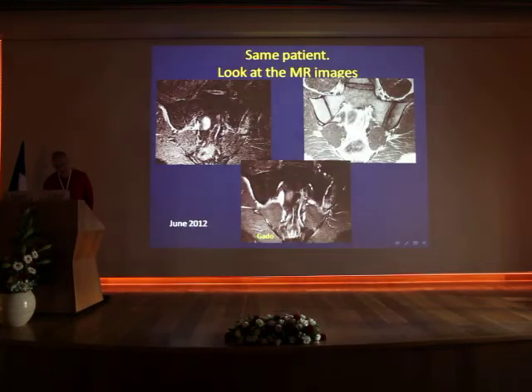Okay. Here we have an MRI of the same patient a few months ago. What do we see here? In the T1, we can see that there is irregularity, some sclerosis, and some erosions at the iliac side of the sacroiliac joint on the left. You see how quite nice the sacral side looks. But here we can see there is fluid within the joint. You can see here quite a lot of edema.